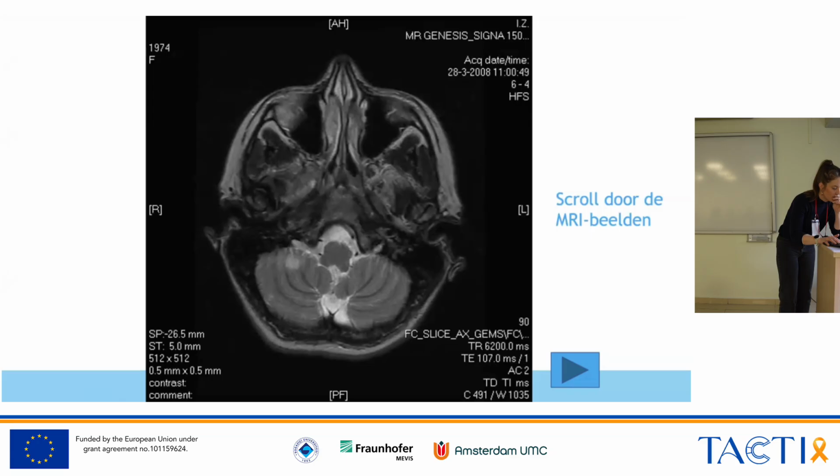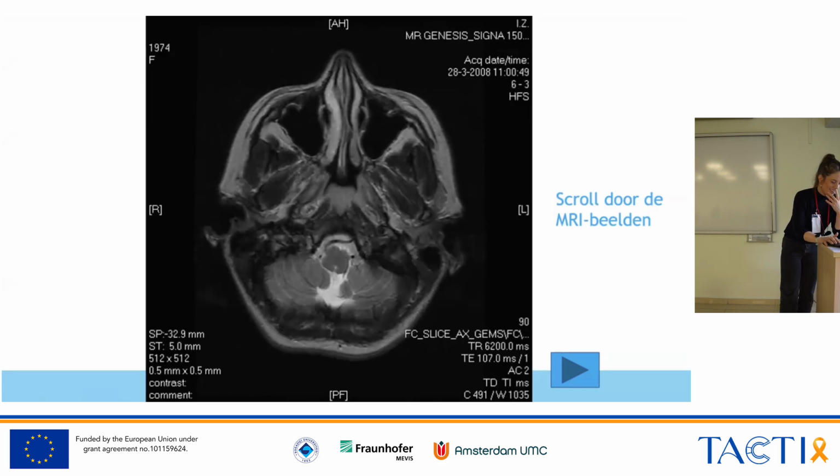It's in the cortex. This one? This one. Yeah, you're right, because you see the foliae of the cerebellum here, the other stripes. So if this was the only lesion, could this count as an infratentorial juxtacortical lesion? That was the expert question, right? No, it can't. You must fit it to one certain location.